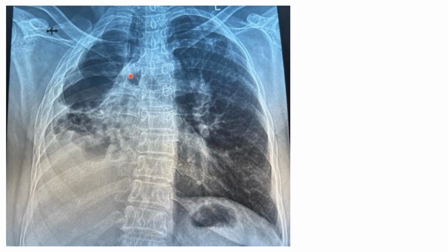So it's kind of a lung that has had some insult in the past, maybe tuberculosis or something like that. But you can see that the trachea is shifted here. So we say that the mediastinum is shifted, the volume is reduced, there is a cavity up here, and this lung seems to be larger comparatively. So there is a volume loss on the right side.